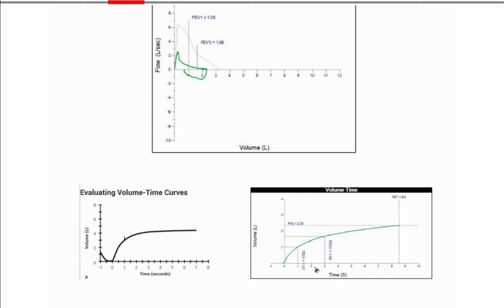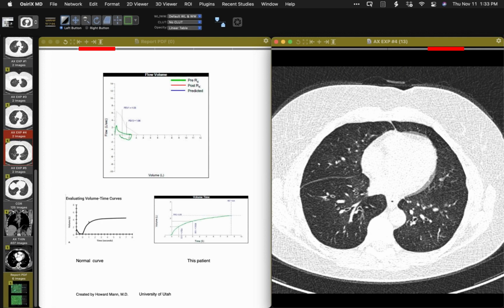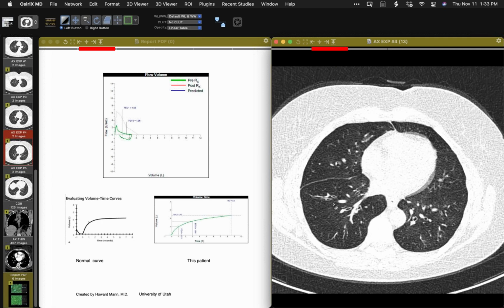So if you press the button to scan the patient and give the patient, say, 3 seconds or so to exhale, you're not going to get any emptying of that lung. It makes kind of sense because this is very severe airway obstruction. So this tells a story as well, and you really have to be aware of that to diagnose properly substantial findings of air trapping.